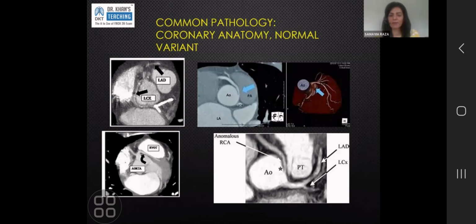Whenever a coronary artery is pressed between two arterial structures, it is called a malignant course. For example, this RCA is coming from the left cusp and is going up, so it's squeezed between the pulmonary artery and the aorta. Those are both arterial structures. When they both pulsate, this will get pressed. If the patient was exercising or stressed, or for whatever reason, if it gets pressed too much, it can give the patient an MI. It can even present as sudden cardiac death.